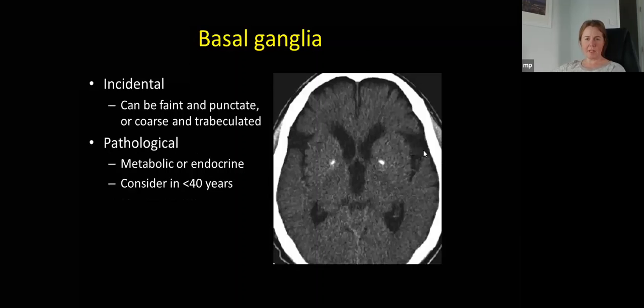Basal ganglia calcification, really common, and in most patients it's incidental. If it's really prominent, I will probably mention it in my report. If it's an 80-year-old, and it looks like this, I sometimes may not even mention it in my reports for a CT head.